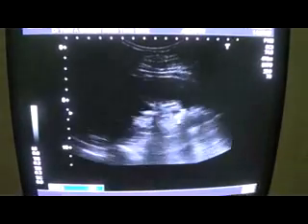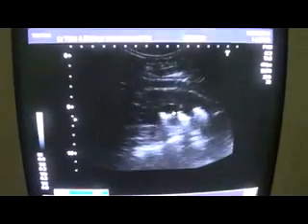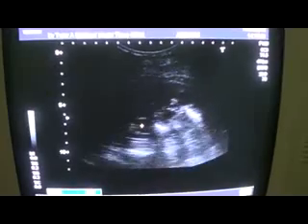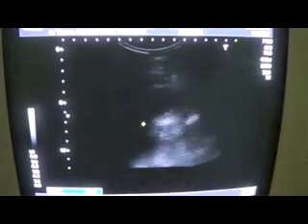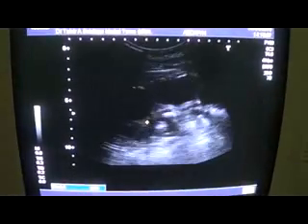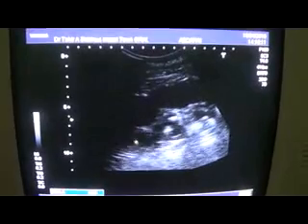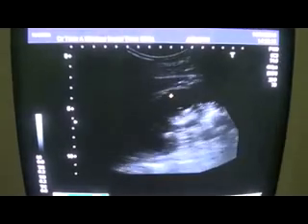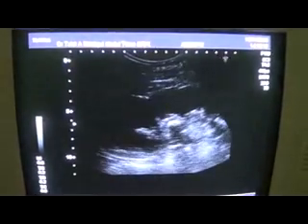This one, again this one, here you see another, here you see. Most of these are aggregated at the lower pole. Now the upper pole is relatively clear of such calculi. This is the upper pole, this is the upper pole, and so let's see.